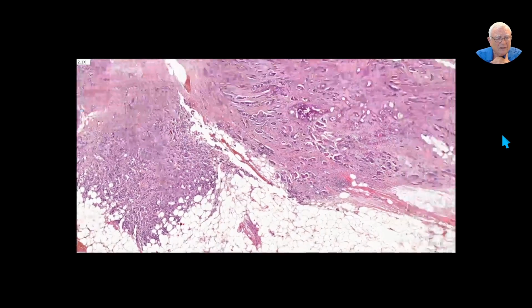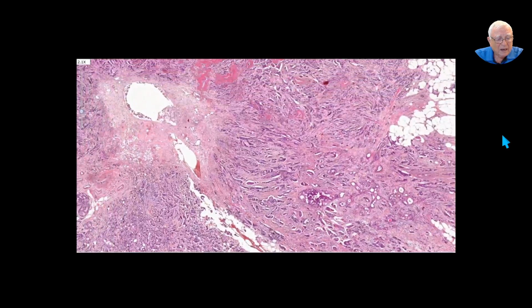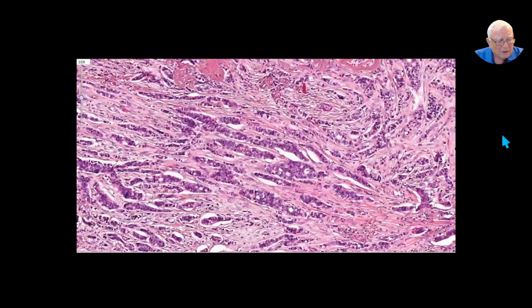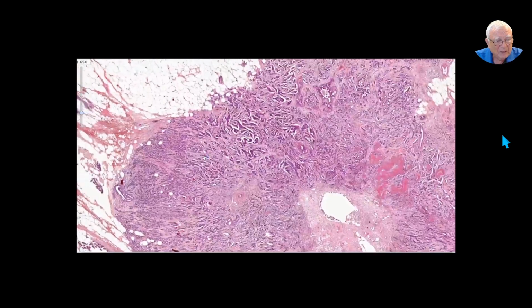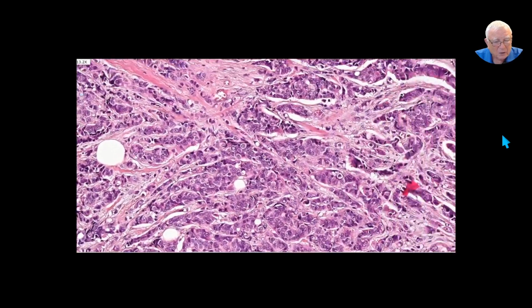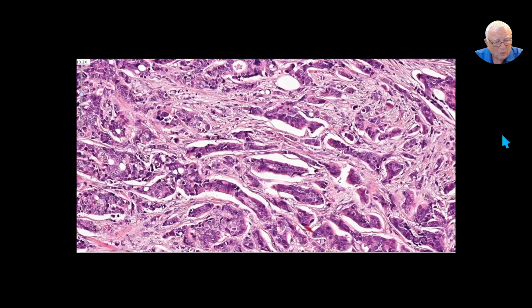You see the difference on the right side? It's more of a so-called invasive micropapillary carcinoma, as if there were these oval openings and smack in the middle, the cancer cells. Very ugly. At 3 o'clock and 9 o'clock, different types of cells. This is what I wanted to show you when you see this pattern, so-called invasive micropapillary.